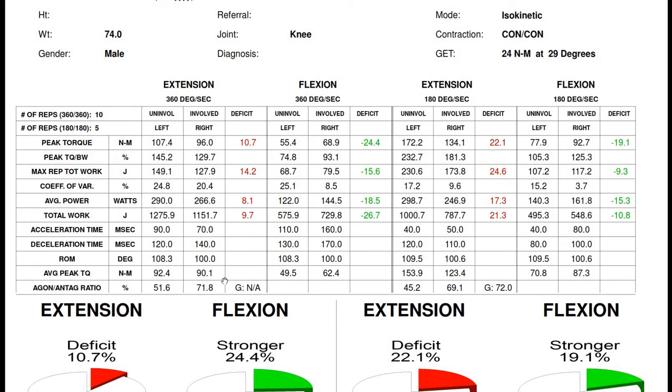And as I say, if you watched or read the previous section, you'll know that the deficit here is about 2 something percent, so not normal, within normative values. A peak value is by definition an outlier, and therefore not always the most useful to go by. So I wouldn't pay too much attention, I wouldn't worry about this too much here.